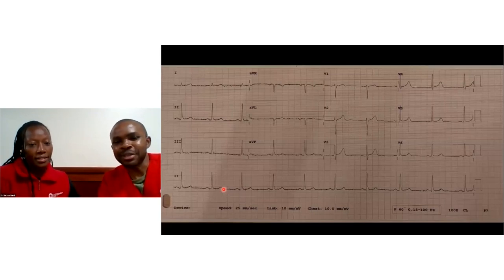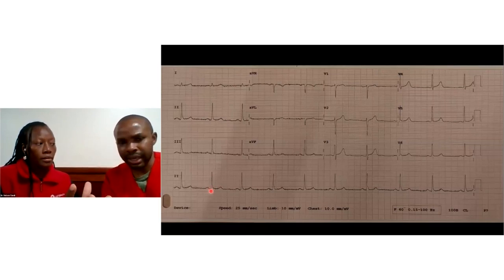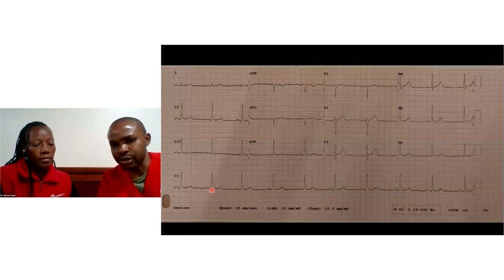Yes. So again, maybe just to recap. So the P wave, and then the QRS complex, and then finally we have our T wave. Yeah. And we are saying that in between the P wave and the R wave, we have what we call the PR segment, which is when the current is flowing through the AV node.